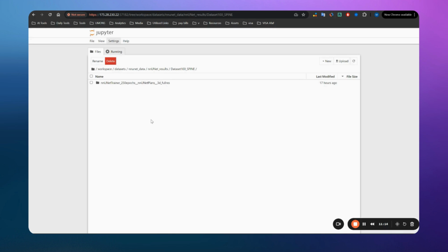I know that this is not the best way to define that, but they are putting it like this. We need to respect it. For me, whenever I work with nnUNet for my projects, I don't leave it like this, but I customize it. I make some changes in the nnUNet code so that I don't need to give all these arguments to specify where the model can find the model weights, the plan.json and the dataset.json. I just need to give one path to one folder that contains everything, which is the logic of how we do everything for our products or our projects. For that, I needed to change nnUNet itself in the inference code.